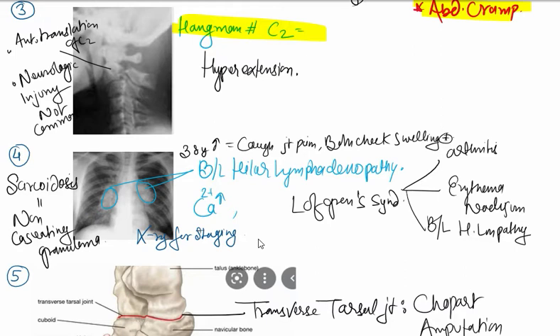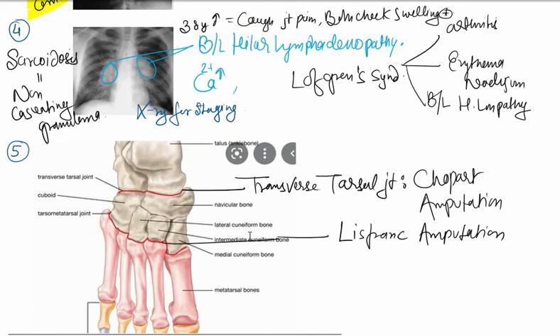So there is anterior translation of the C2 vertebra, and neurological injury is not common in this patient. Why is this a fracture? What is the mechanism? Hyperextension force.